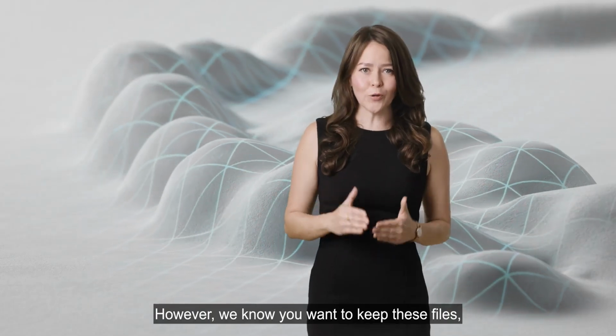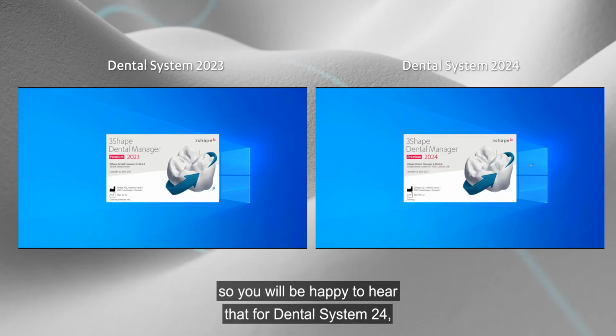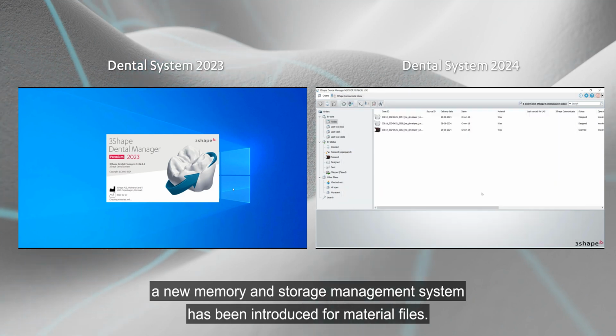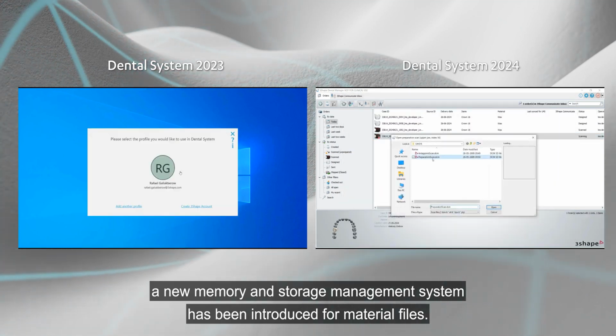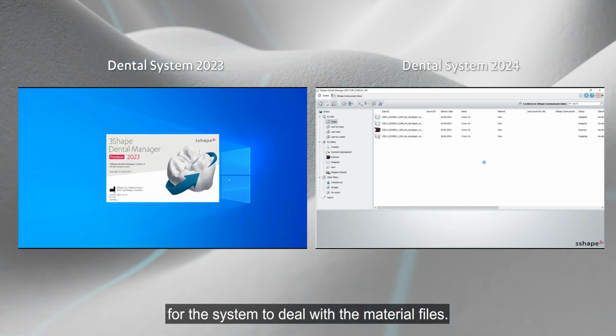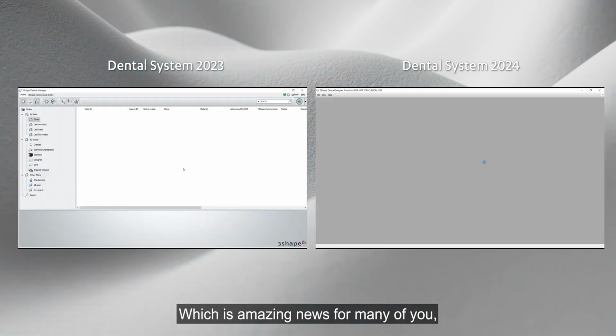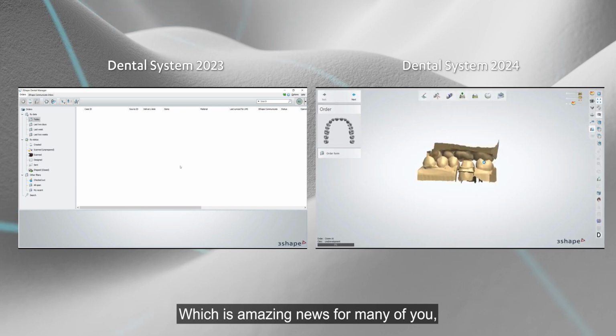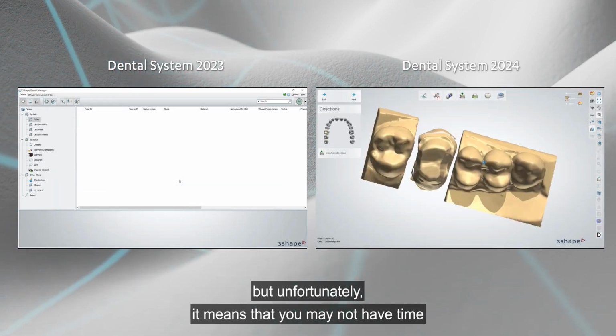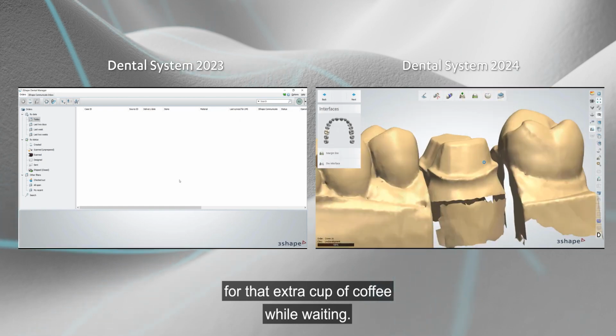However, we know you want to keep those files, so you will be happy to hear that for Dental System 24, a new memory and storage management system has been introduced for material files. This significantly cuts down the time it takes for the system to deal with the material files, which is amazing news for many of you. But unfortunately, it means that you may not have time for that extra cup of coffee while waiting.